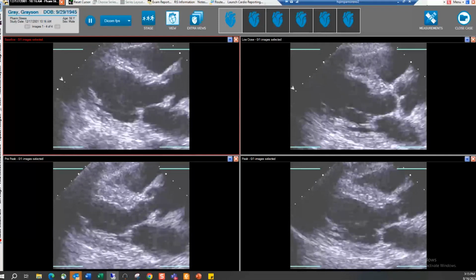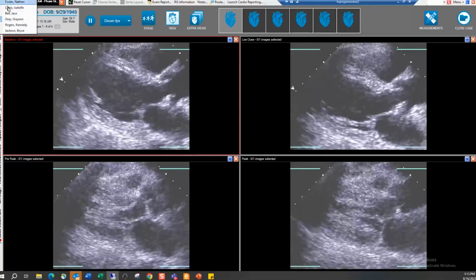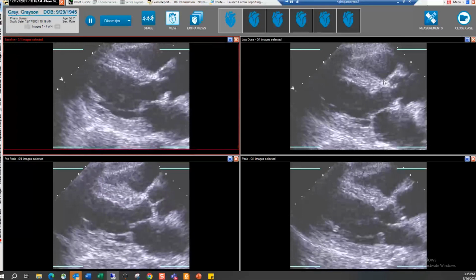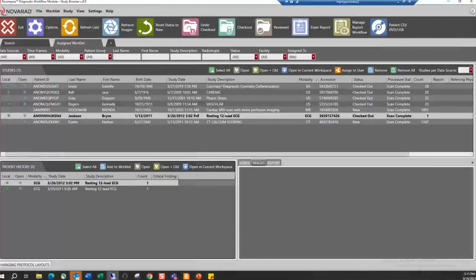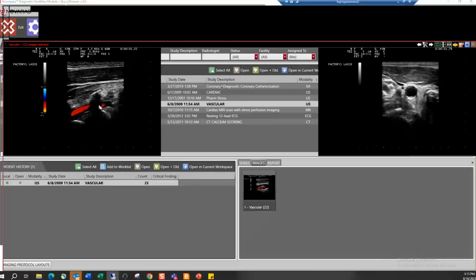So the next study I'm going to look at is Rogers. No, maybe I have the wrong name. So it's a vascular. Give me a second. Let me go to my list. It's Rogers.